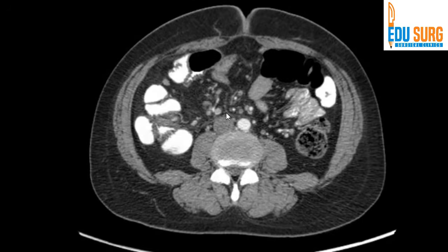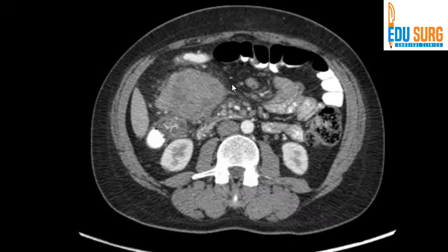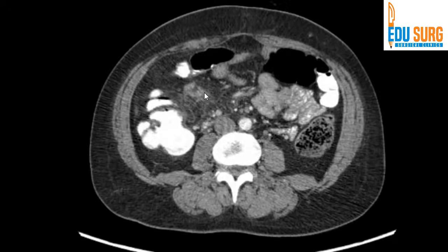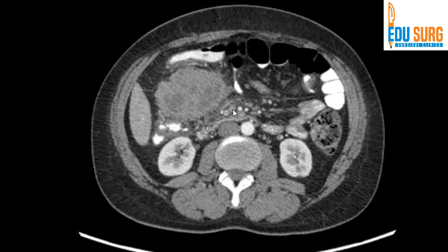That's the ileocolic area, but also has a big ileal branch. So you have to protect this ileal branch and take the remaining ileocolic. So somewhere at this point, you will be ligating the ileocolic and the right colic. So that is the basis of seeing the portal venous phase in this scan.